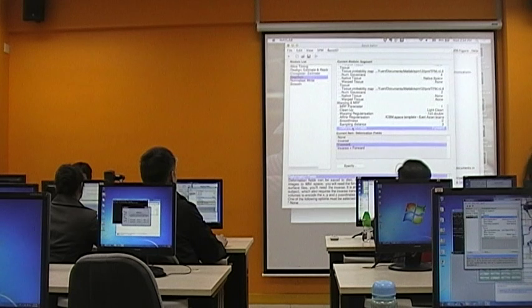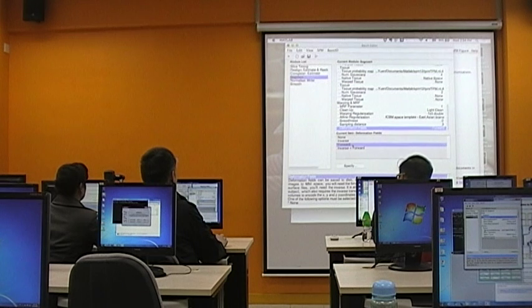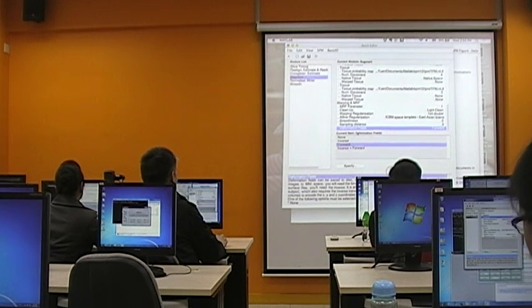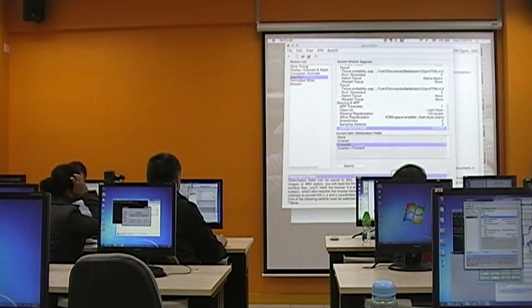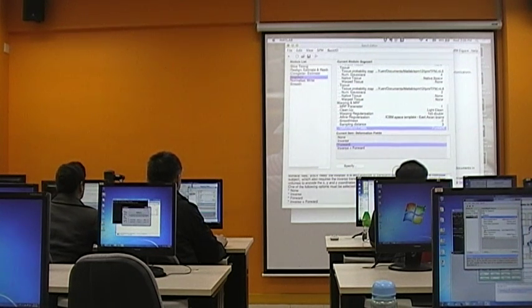And then for deformation field, which is the parameters for you to normalize the images, you will need the forward deformation. So if you are not so sure whether you should use inverse or forward, you just take a look at the instruction or the tips behind here. So you could always find some useful information.